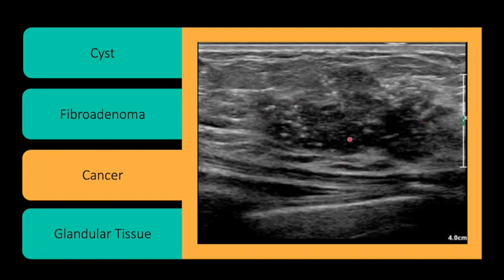Another clue is that while fibroadenomas tend to lead to posterior acoustic enhancement artifact, carcinomas will often have these little shadows that come down. In this image, we have a linear probe footprint up here, and we see an unknown orientation on the breast, but there's this hypoechoic lesion with irregular borders that's got some posterior shadowing, and so in this case, it would be appropriate to recommend biopsy.